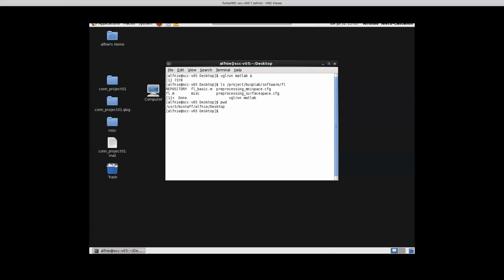Yeah, I think so. I was under the impression that the speech ROIs, like our labels, would be different for each individual on the FS average brain? Yes. So, think of it the other way: you take the speech ROIs on the FS average brain, and then you map them out to the individual. They're going to look different. The shape will look different in that direction.